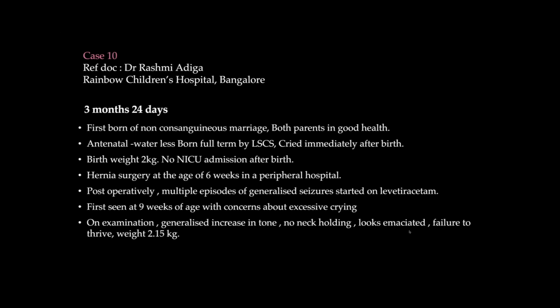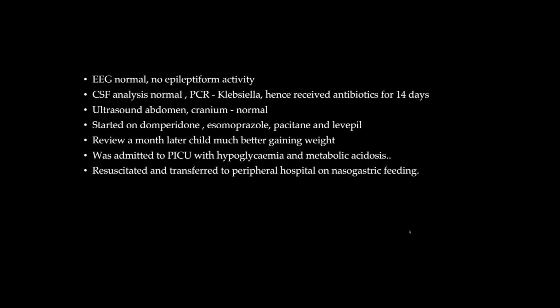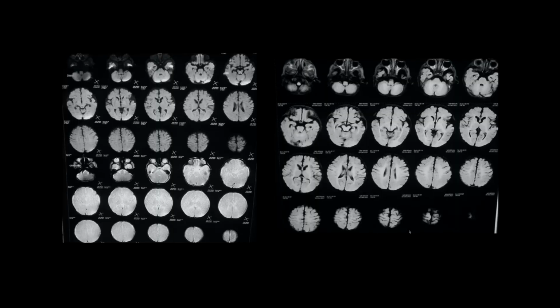Okay. We'll probably continue the discussion after the imaging. So the scan was done at 3 months of age, Dr. Rashmi? I've written. The scan would probably have been done at 3 months and 15 days or something like that. Okay. So you have the diffusion on top. I cannot find any signal changes on diffusion, no areas of cytotoxic edema. Nothing on the slightly degraded GRE images, no focal areas of hemorrhage or calcification.